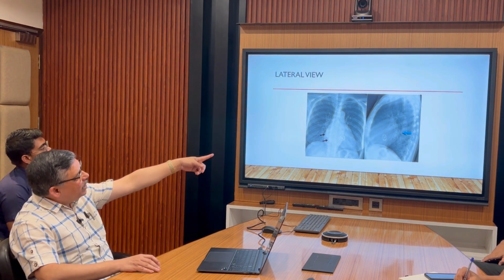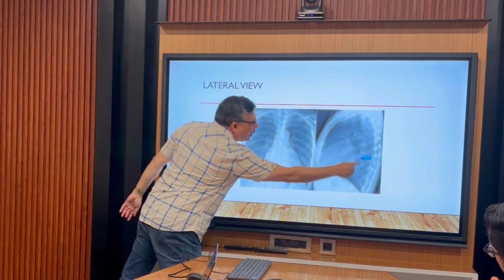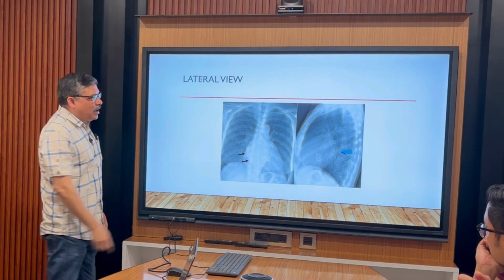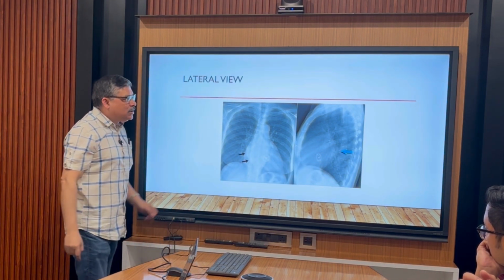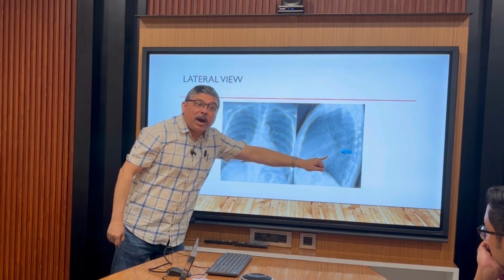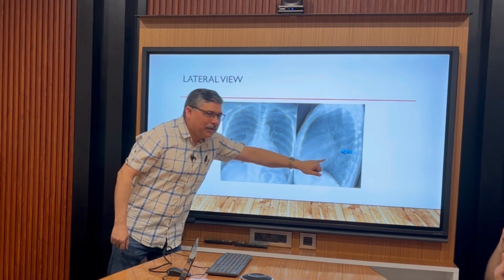Okay. Can you make out the lateral view X-ray? It is so nice. You can make out the heart. See, this is the aorta, this is the ascending aorta, the arch of the aorta and the descending aorta. You can make out everything in that X-ray. This bulge is the left atrium. So what constitutes the borders here? You see the aorta. The upper part is the left atrial part because the left atrium lies posteriorly. So in a lateral view, this is the left atrium.